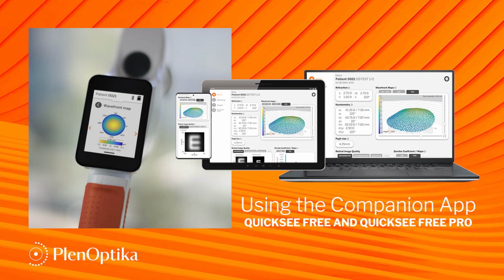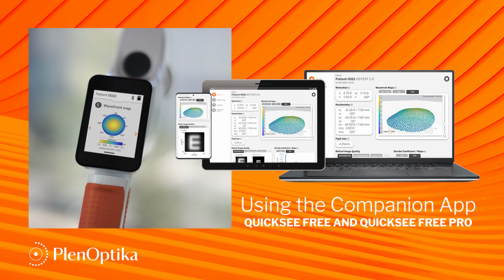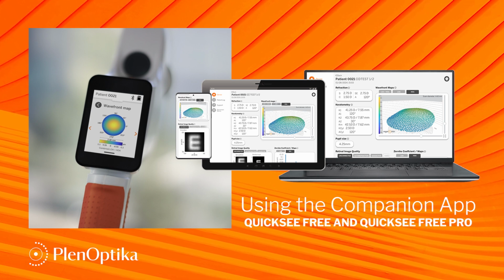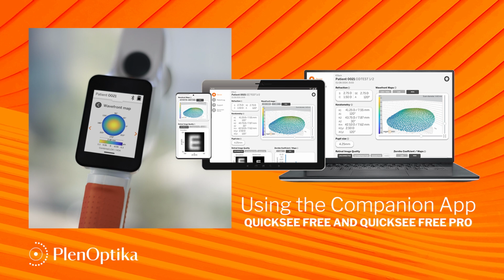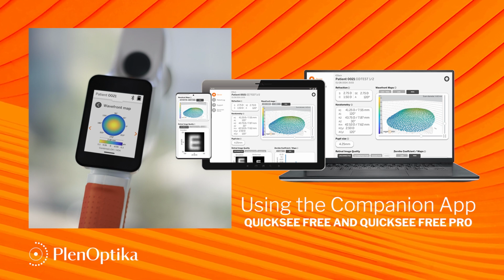Hello everyone. In this video we are thrilled to introduce the updated QuickSee Free Pro keratometry version 6, which brings advanced features to enhance your experience when performing vision exams.